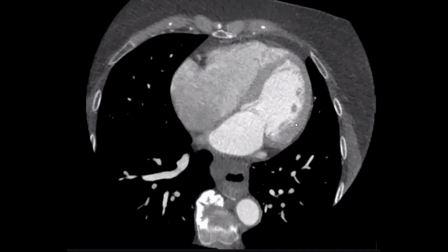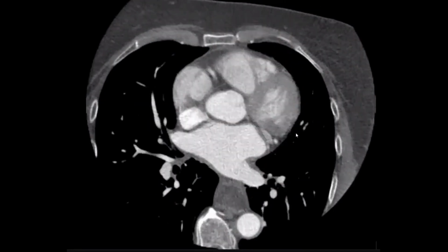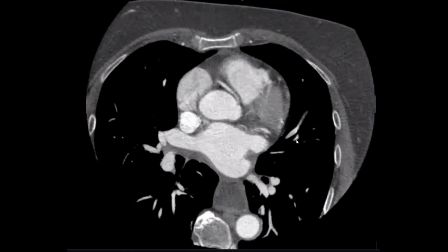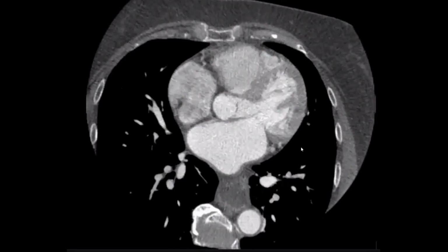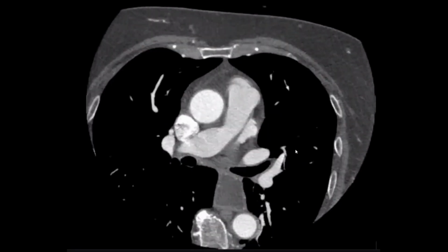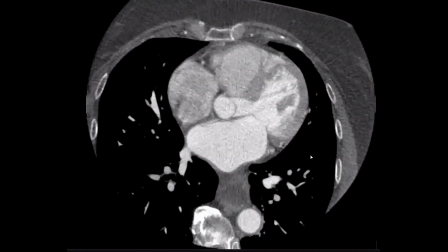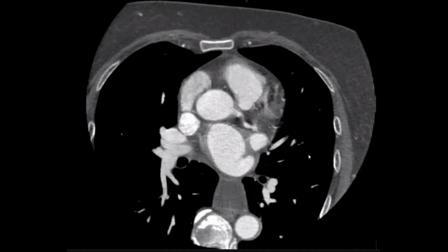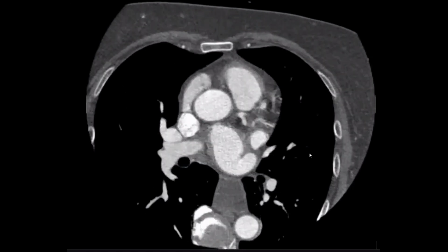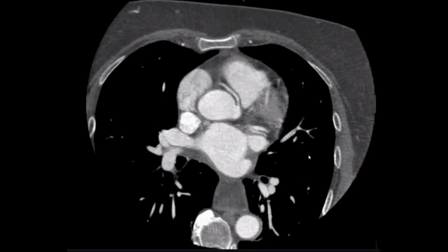It's very nice and straightforward. So I've been provided with an axial cut CT for the chest with contrast. I am looking at the blood vessels. The left atrium appears normal, and the veins also appear normal. I want to look further.